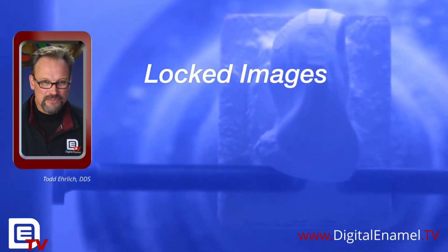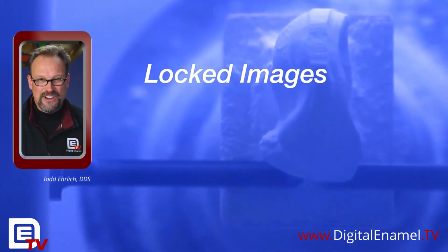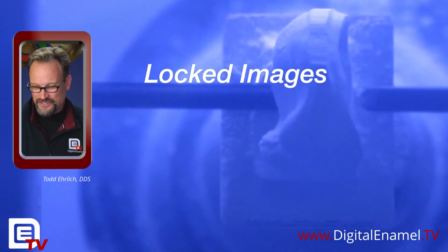In another video I talk about why you shouldn't alter the models, but have you ever looked at how you undo the locked images? So we're going to go over that.